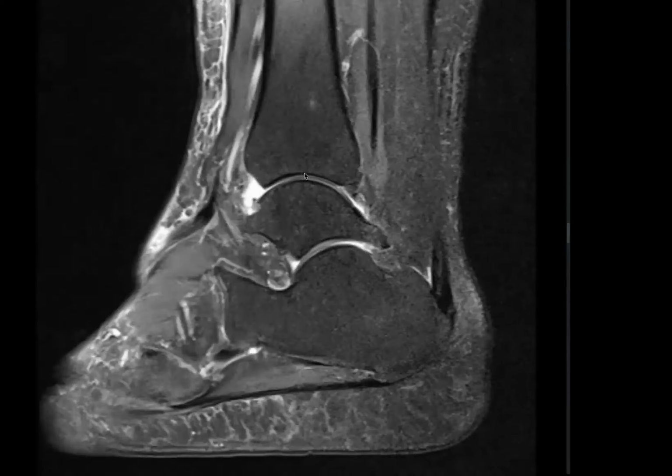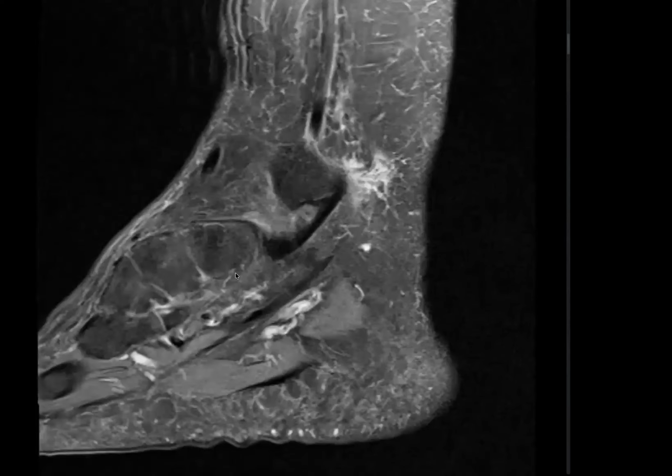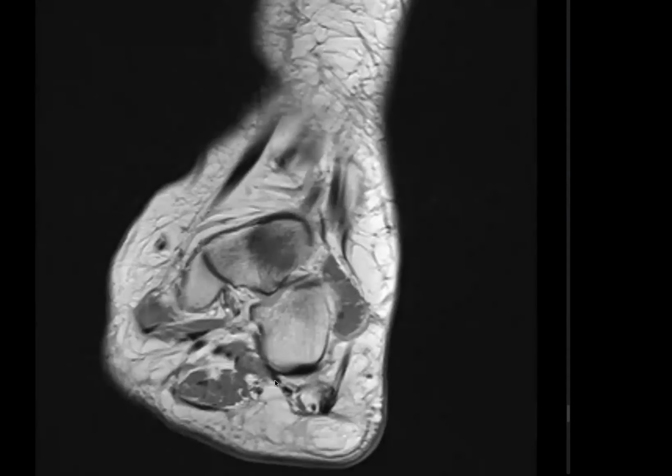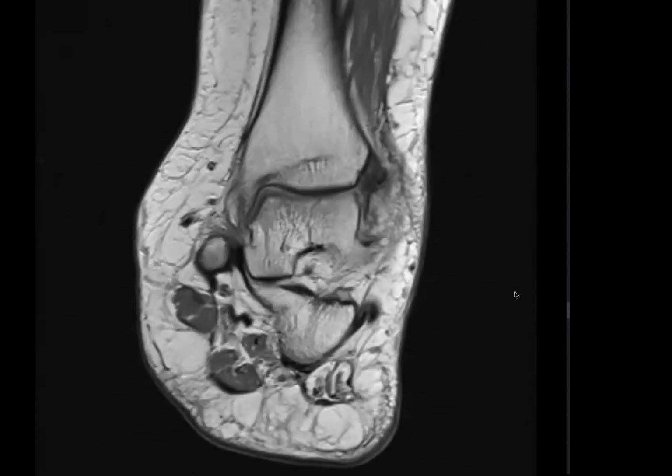So I can give you coronal PD or coronal T2. Let's start with PD. Sure, sir. Here you go.